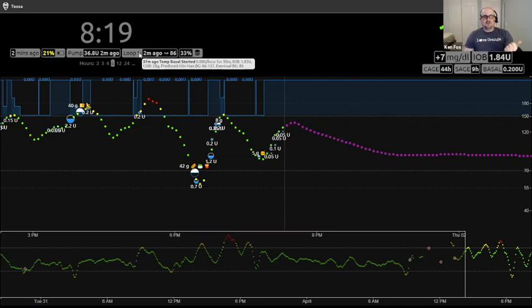So if you hover over the loop one, you'll see all kinds of stuff. It's basically a lot of the information that Loop is sending back to Nightscout to be saved there. So the minimum and maximum of the prediction, what's the highest and lowest point in that prediction? How many carbs are on board, insulin on board, the last temp basal it tried to run, and where you're going to end up, your eventual blood sugar. Everything about the prediction and everything Loop's doing is in that pill at that moment in time that you're looking at it. So you can do that with all these pills.